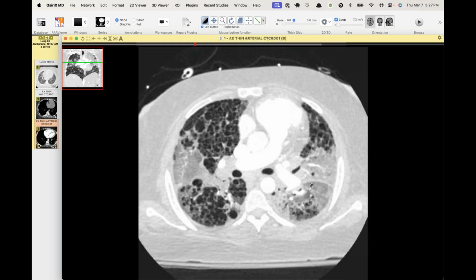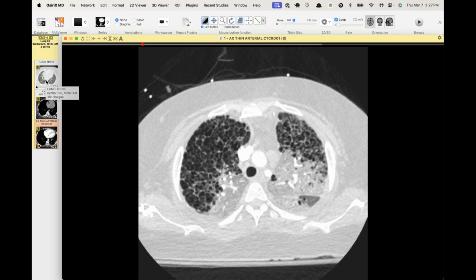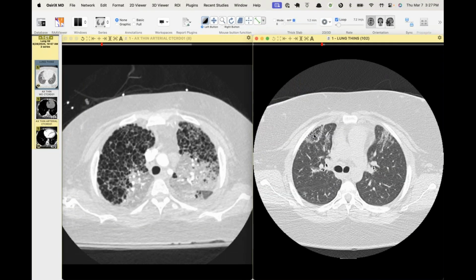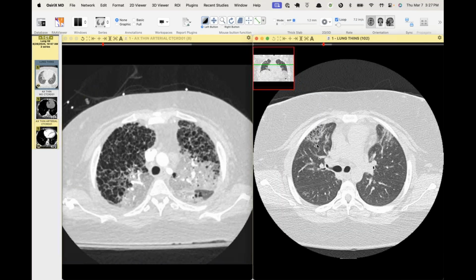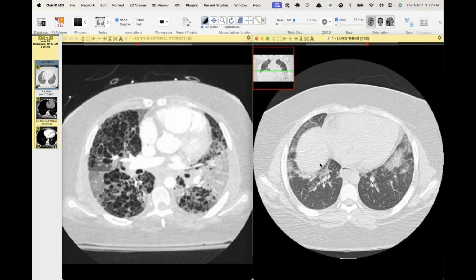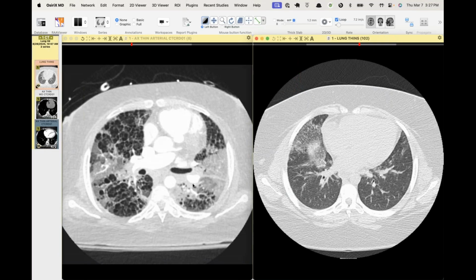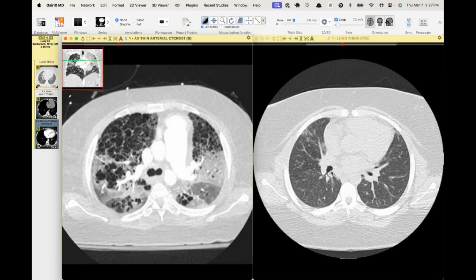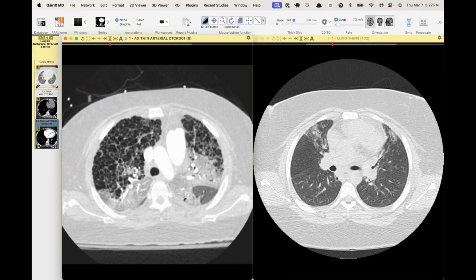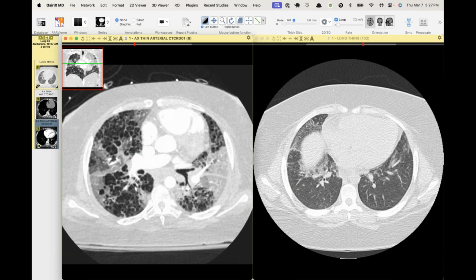This is a patient in their 20s who has systemic lupus. And I've never seen this degree. I remember Brent showing, and I think they published some of those cases of lupus with kind of the four corners distribution when they do get involvement of the lungs. And there is a patulous esophagus. You wonder if there's some overlap with scleroderma or some sort of mixed connective tissue disease. But this has progressed, and she's symptomatic.